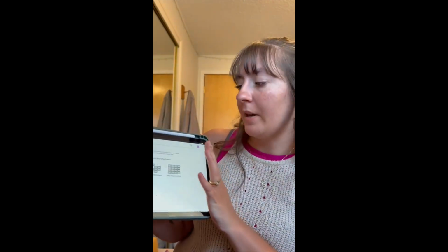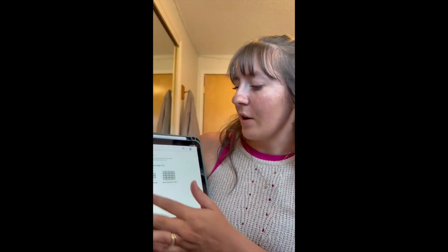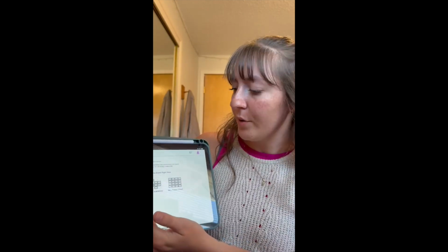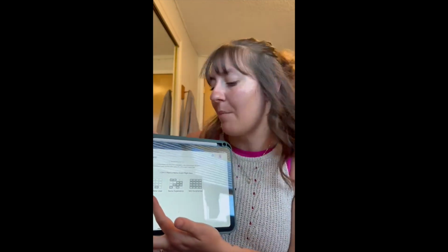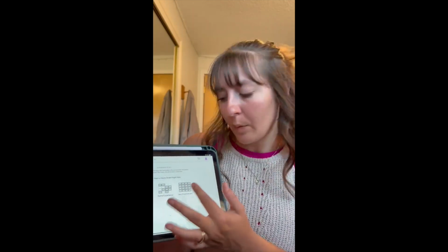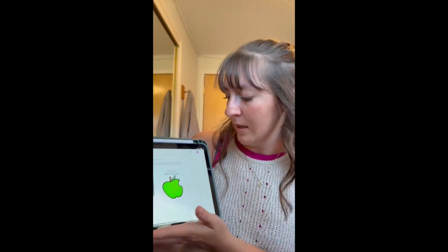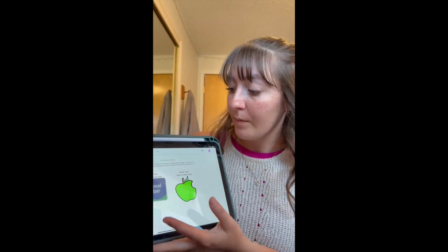Alright, so then it pops up right here. And so it says finding the right home board. And then you're able to choose, are you a brand new user? So this is just like limited buttons, somewhat experienced, very experienced. So we're going to say that we're very experienced. And then it gives us a couple options.